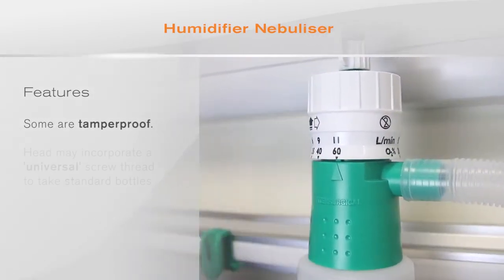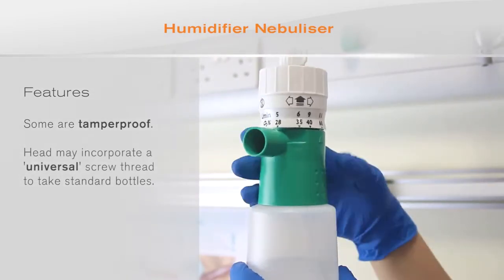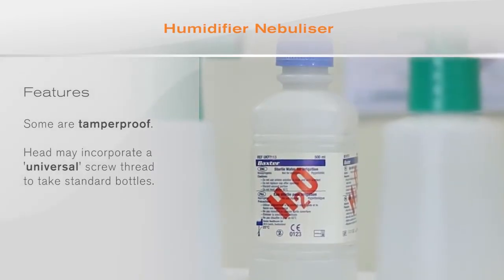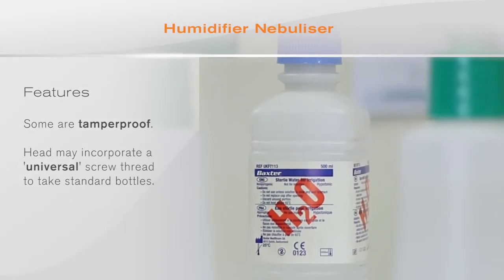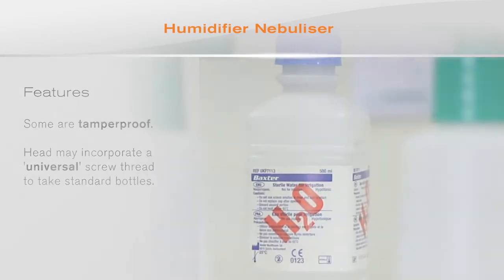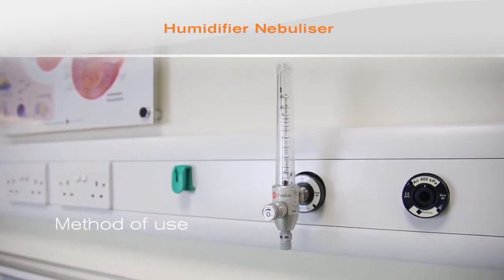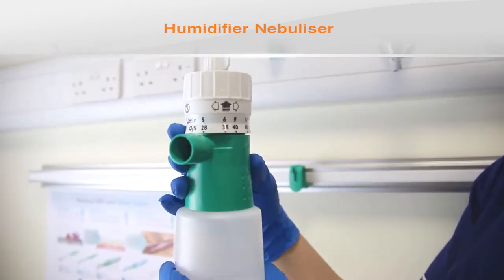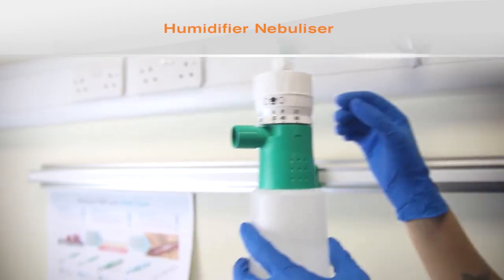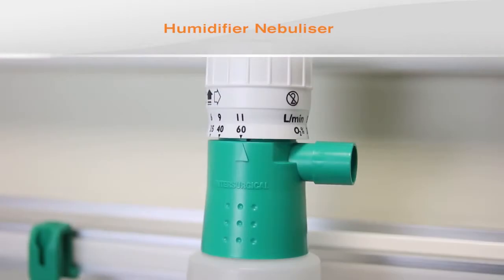As with bubble humidifiers, the head of the Aquamist nebulizer humidifier incorporates a universal screw thread. This permits the use of a bottle which can be refilled with sterile water or the use of some pre-filled sterile water bottles. The flow meter should be attached to an appropriate oxygen supply. Fill the bottle with sterile water using an aseptic technique and fit to the humidifier head. The humidifier nebulizer should then be attached to the flow meter.